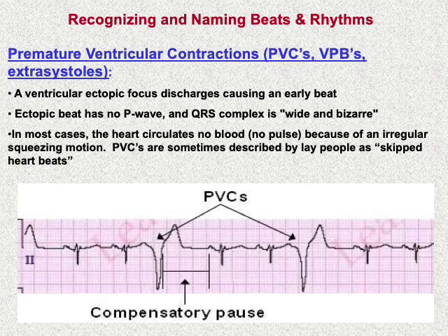This signifies PVCs. And there is usually a compensatory pause, as you see here, because the next P wave will come here, but it will not fire because the ventricle is refractory, so the SA node will not be reset. So this is the second P wave. As you see here, we have a compensatory pause. And if you calculate the RR interval between here and here, it will be double the one from here to here. So this is what's termed compensatory pause.